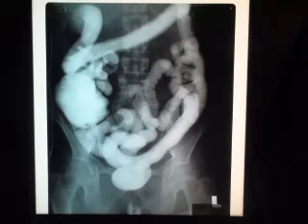This is also barium enema, strange pattern of colonic mucosa with the loss of its haustration. So it's characteristic of ulcerative colitis. You should have an answer for what is the presentation for this patient, what is the complication of ulcerative colitis, what are the lines of treatment of ulcerative colitis. These are also very, very important questions that can come with this X-ray film.